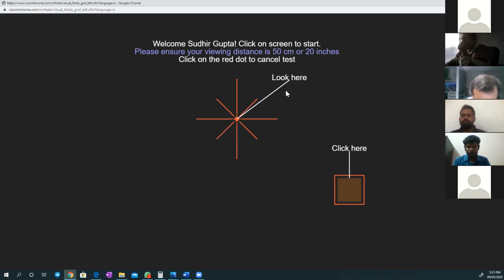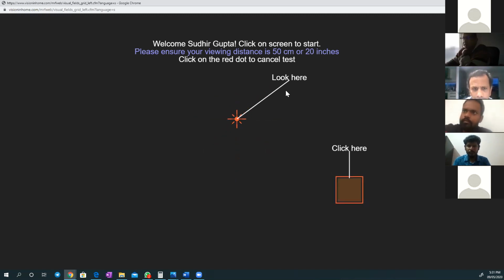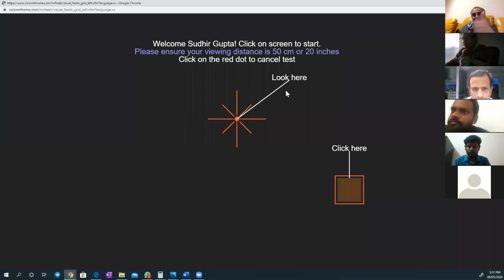Hello, welcome to MRF Visual Field Application. Guys, just checking, can you see my screen? Okay, good.